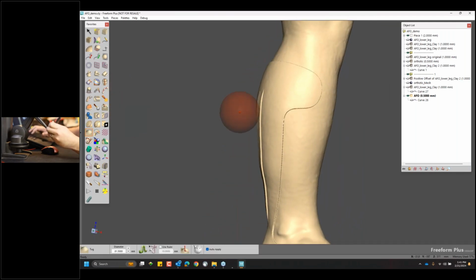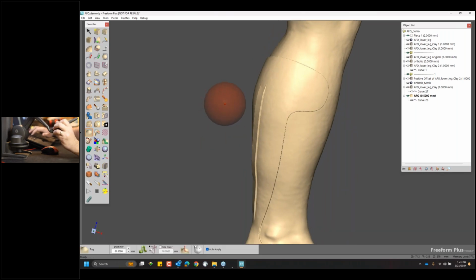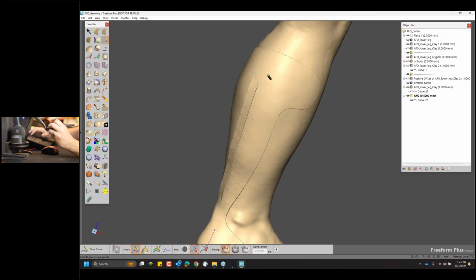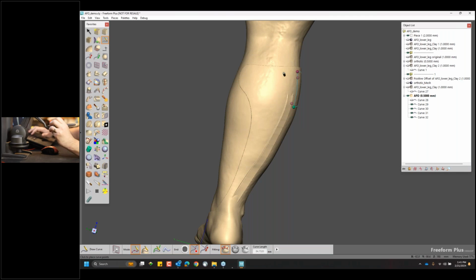Another thing that we can do from here is if I wanted to do something like, actually, I will create the curve regions to add perforation and breathing areas. So I'll just lay a couple curves that are fit on the surface. Define where I want these to go. I'll do one on either side.